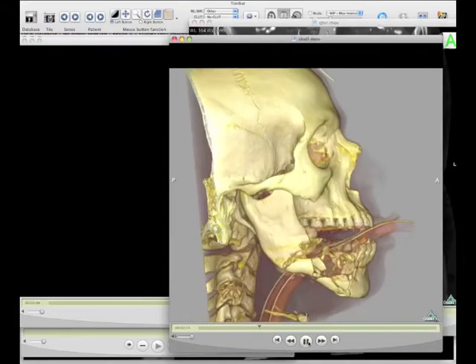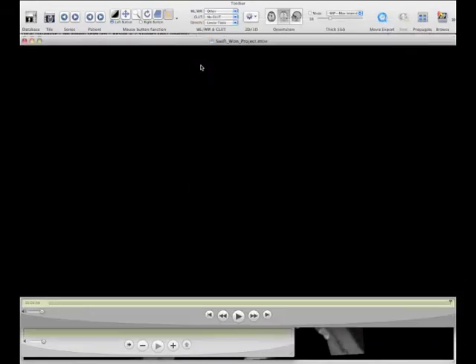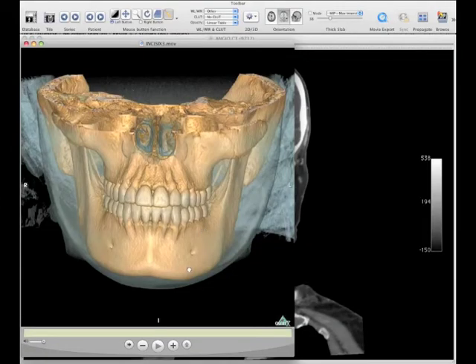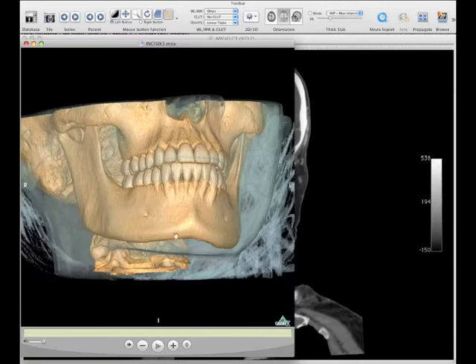Again, this is another 3D volume rendering of a broken jaw from an auto accident. And the other thing we can make is a fly-through, so an endoscopic fly-through like this, where we're looking down the bronchioles, right? And another 3D reconstruction, right? So this has the full range of values, and we can add lots of colors to these.